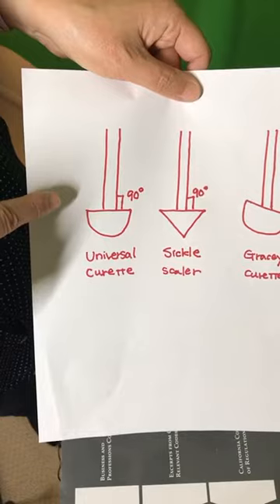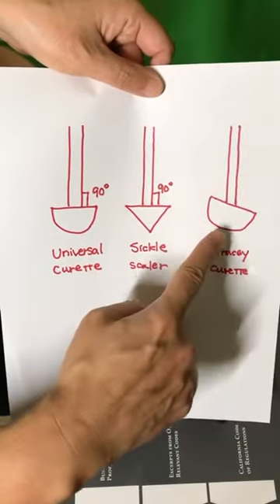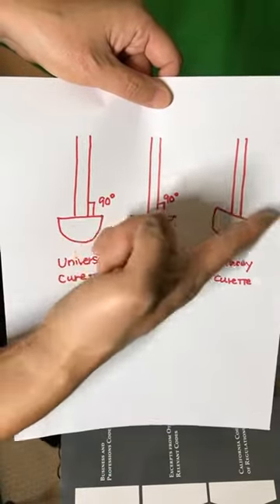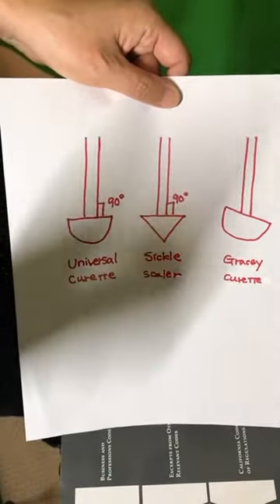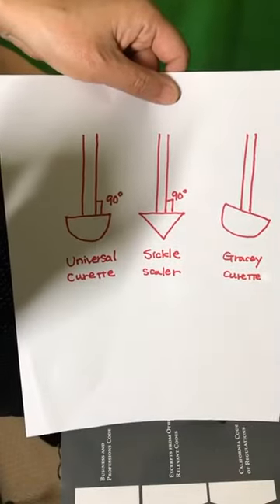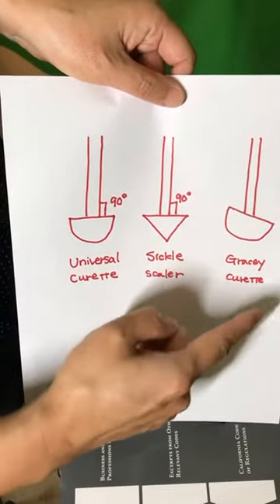Recent innovations could come offset. Offset is something like this. The relationship of the terminal shank to the face of the blade is not a 90-degree angle. So when it's offset, that's the time you're probably having a hard time finding which cutting edge to use.